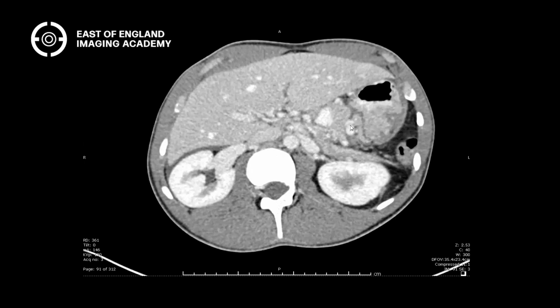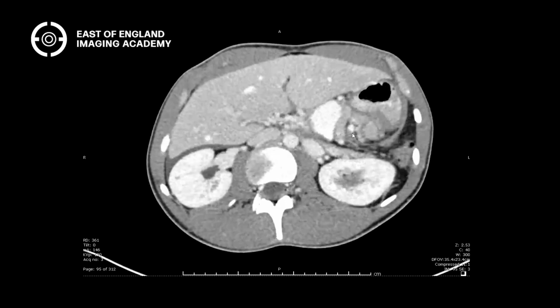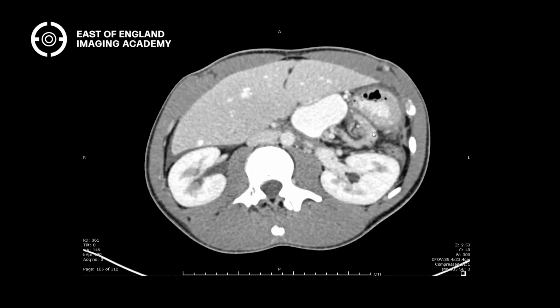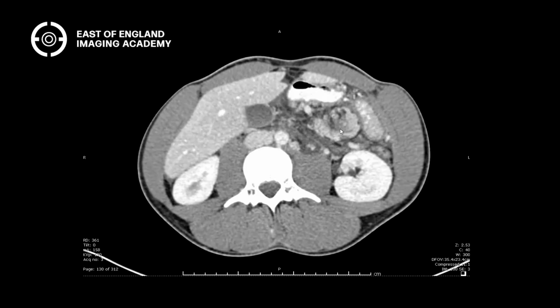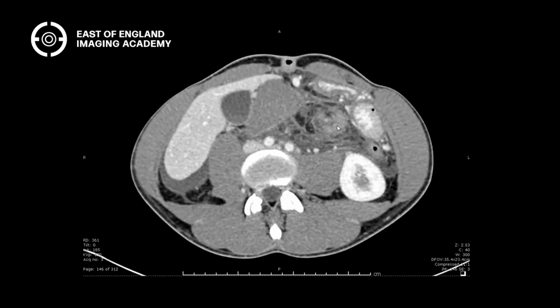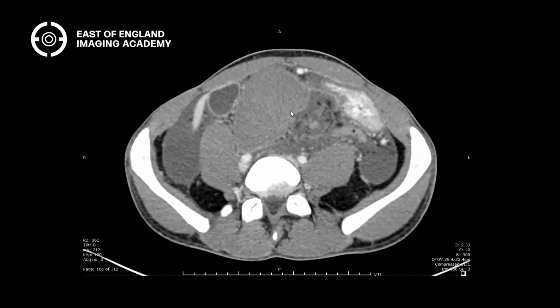right? So if the spleen is down in the pelvis, you can actually see the splenic vein here comes down and then it occludes, just disappears because of the twist. And then the pancreas goes wee round and round and round, and the tail of the pancreas, you can see it also isn't enhancing quite as well because it's also infarcted a bit, and then you end up with the spleen right at the bottom.